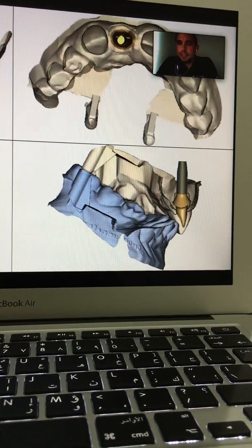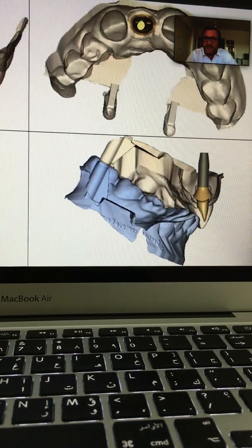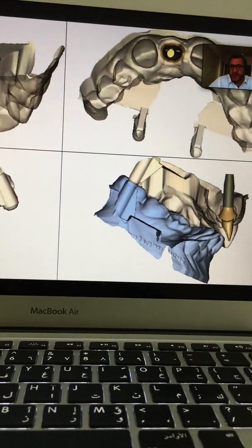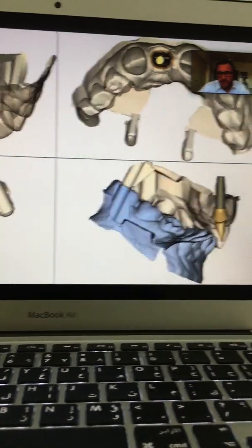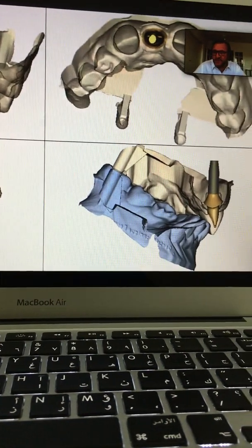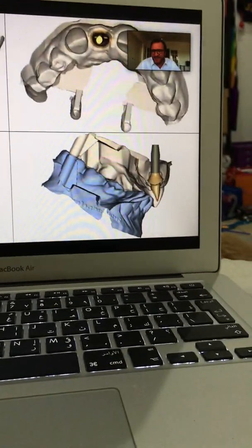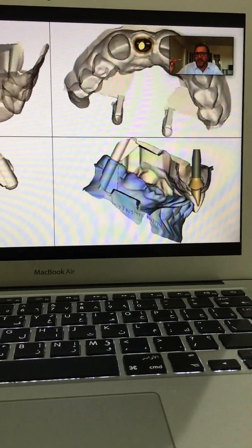So I would say the size of the connector, especially in the low. We have that directly inside the software, and it really depends on what kind of material I have to use. So I can answer directly on that. I can perhaps send an email to the participant about the different kinds of parameters with different kinds of material.